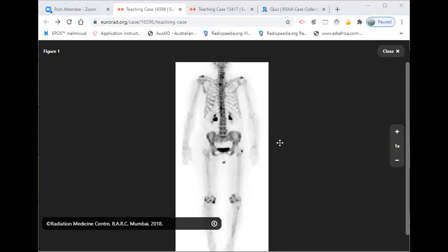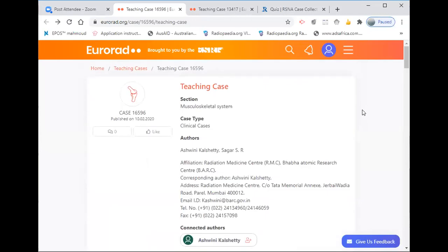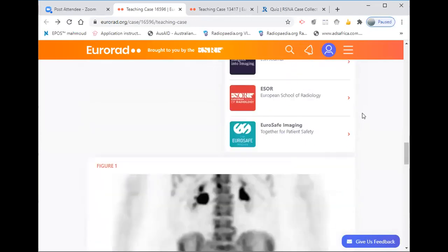Do you see anything abnormal? Sure that you will look for the asymmetrical uptake, and you will check because this cancer is breast cancer. It is a PET scan, okay, for sodium fluoride tracer, which is for bone metastasis. So we just want to check what is in the bone here, could be a metastasis or not. So let's have a look at the other images she has.